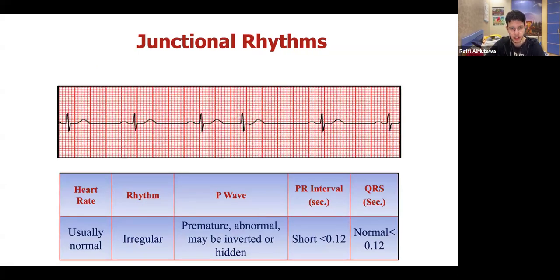Okay, what about here? What do you guys see? Don't tell me what the diagnosis is, tell me what you're seeing. Some are missing P waves. You're right.